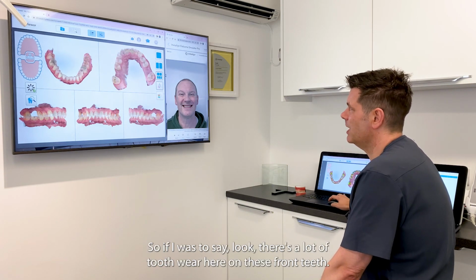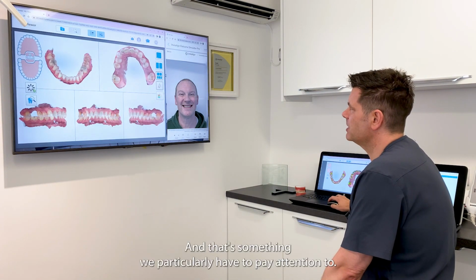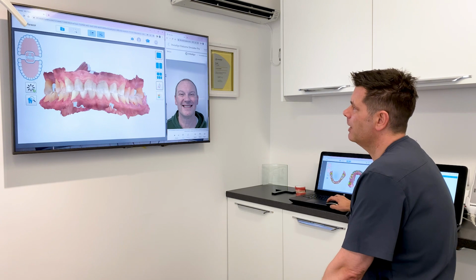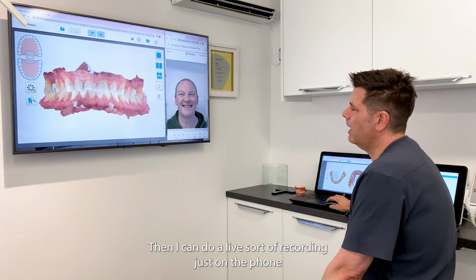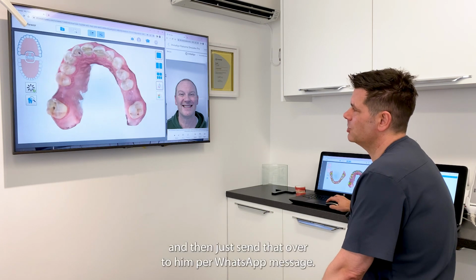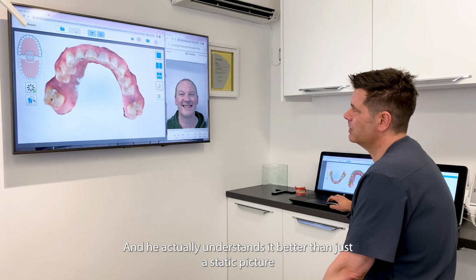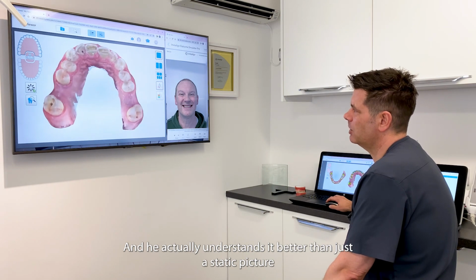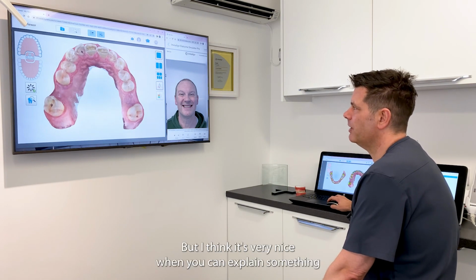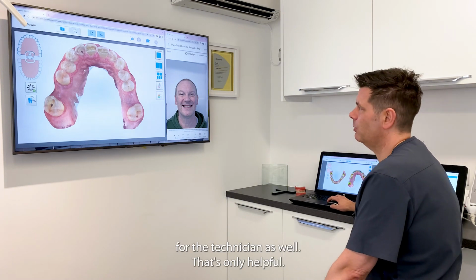So if I was to say, look, there's a lot of tooth wear here on these front teeth, and that's something we particularly have to pay attention to, then I can do a live recording just on a phone and send that over to him per WhatsApp message, and he actually understands better than from just a static picture. STL files are great, but I think it's very nice when you can explain something to the technician as well. That's only helpful.